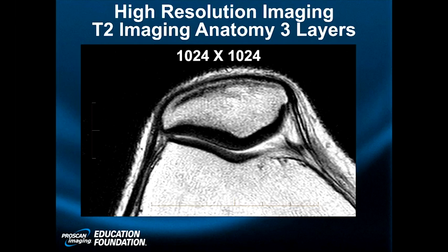Now let's take the patella as an example. Here's a high-resolution 1024 matrix. It's a T2 FSE with a small field of view. That's gorgeous. Look at the lighter signal of the superficial layer. Now this would not be a sequence I'd use for stratification, but it is a sequence I use for superficial chondromalacia. See that little area of fraying? That's just wear and tear. That's called living, existing on the earth.